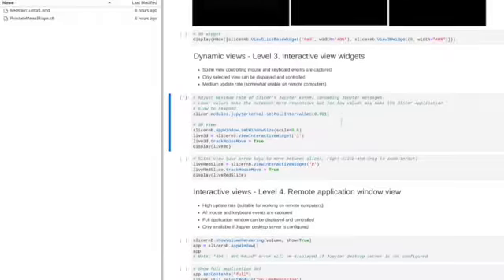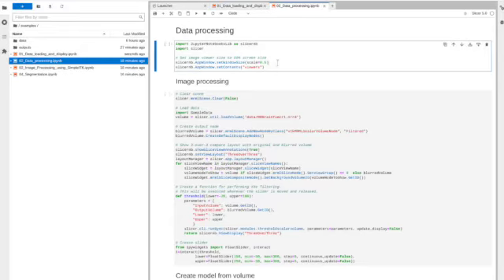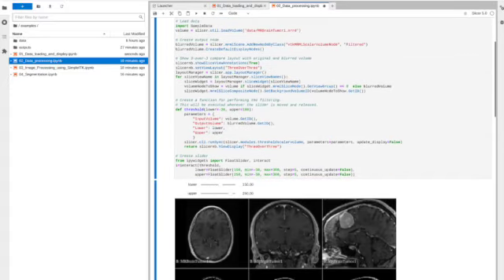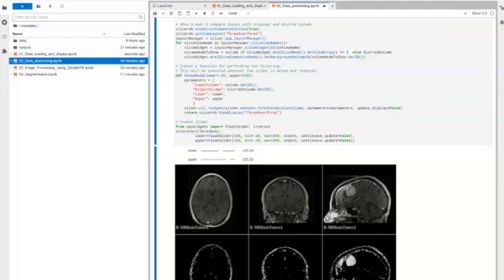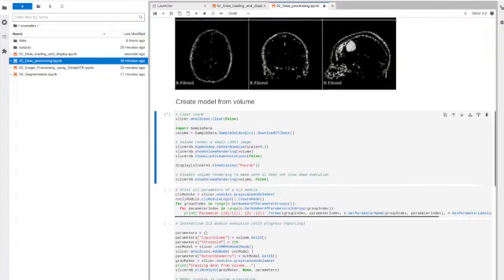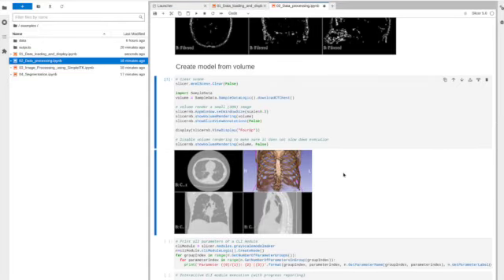So while that is loading up, I want to open another example, which is, I believe, this one. Okay, so this is using different types of filtering. Oh, we have someone to join us. Okay, yeah, so this is where I want to sort of get.